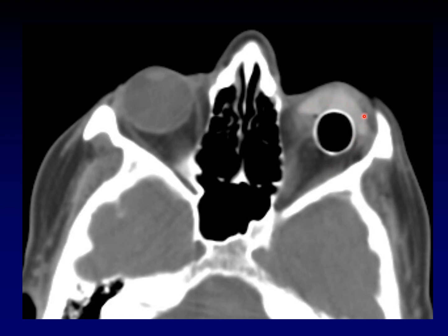The problem with the older glass eyes is that when you move the good eye, the glass eye sits still and it's very obvious to an observer. But in this case, the prosthesis, because it's attached to the extraocular muscles, moves with the eye itself, and so both eyes track together and it's a much more convincing forgery.